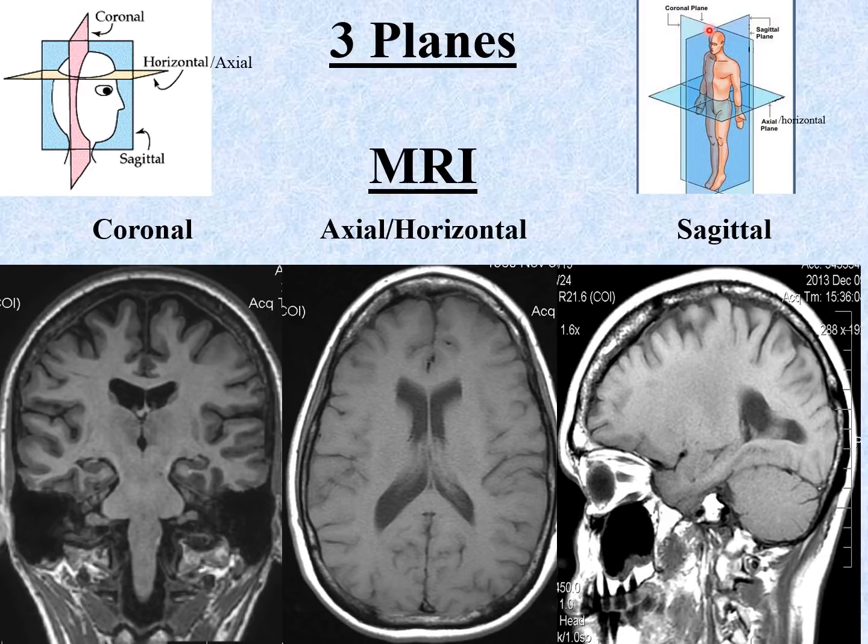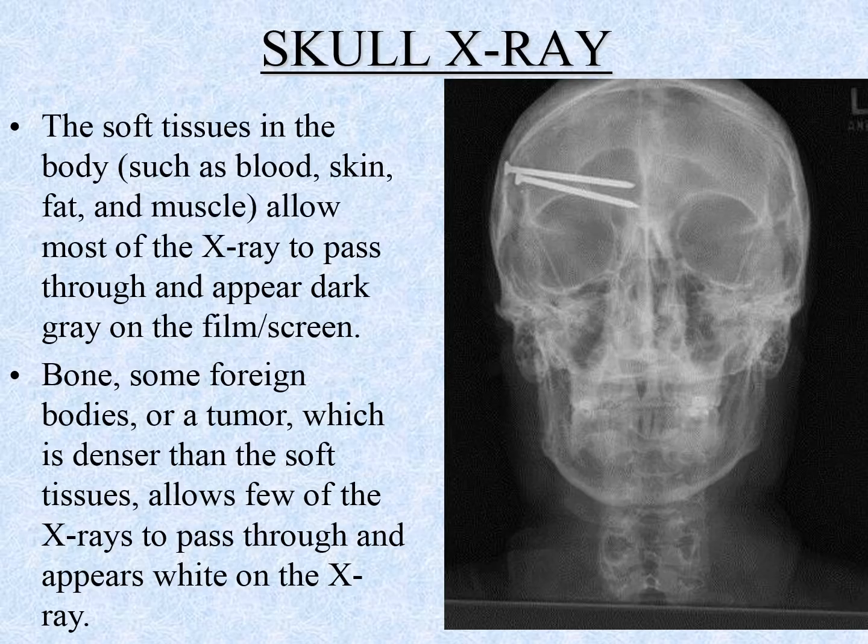It's essentially a cut down the midline and can be off the midline, moving gradually laterally. So we'll sometimes have images in three different planes.